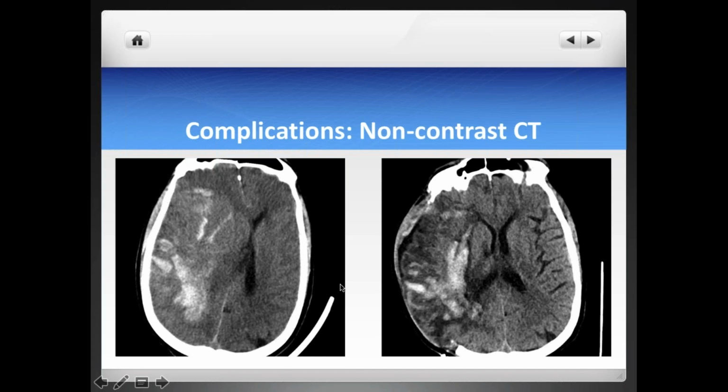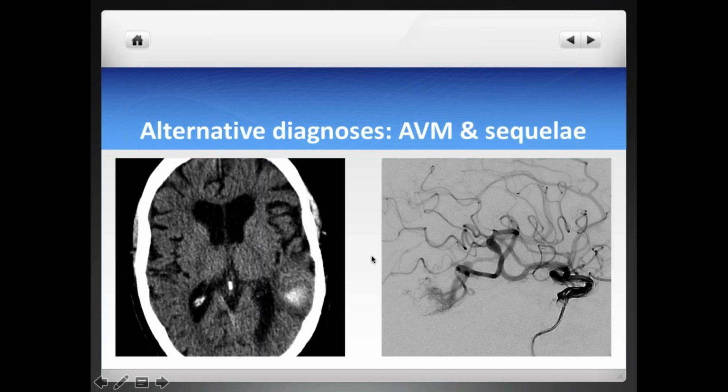This patient had no ischemic stroke, but indeed he had a hemorrhagic stroke, which was mimicking a right MCA occlusion, because the patient came with sudden onset of left-sided weakness, except that in this case, the patient had a very large bleed and proceeded, of course, to decompression craniectomy. Important to look at other diagnoses as well.